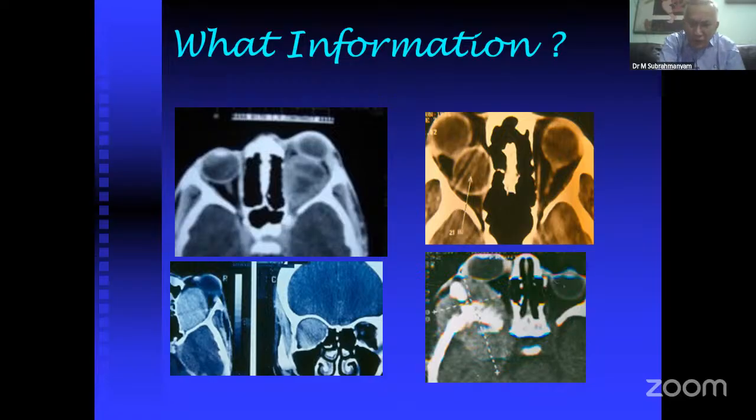Here, if you look at this, you are seeing a cyst, a little bigger than the eyeball, with a clear-cut cystic border and uniform fluid.